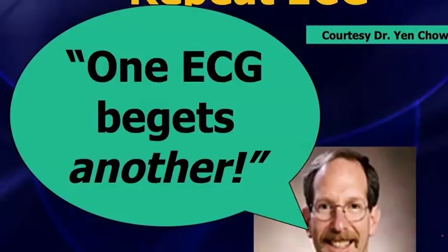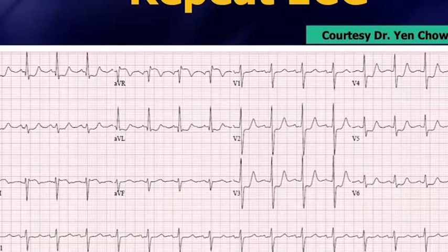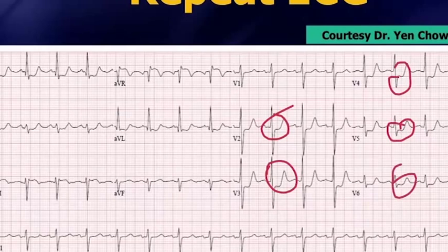And I would say that I would agree with that, certainly in somebody who's got any symptoms or if there's any concerns. Dr. Chow, remember, went ahead and got a repeat 12-lead EKG, and now those changes on the repeat 12-lead EKG are not subtle anymore, are they? Even your 12-lead EKG is going to pick this up. There's big-time ST depression in a handful of leads, and there's also ST segment elevation in lead AVR, more ST depression out here in the limb leads.